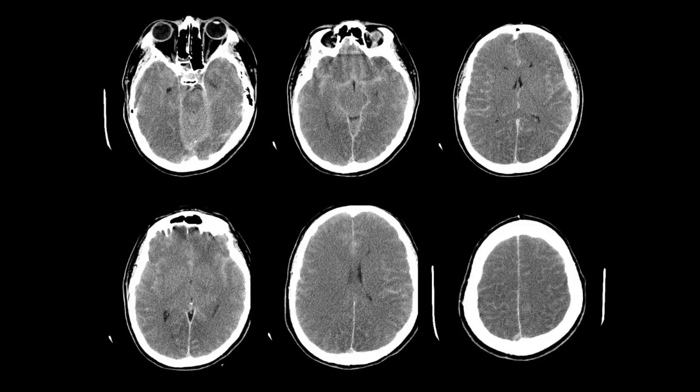We're going to finish our presentation. I wanted to show you that not everything that is bright on CT is necessarily an intracranial hemorrhage, and that's something that is very important to remember. There are a couple of mimicking conditions. So you have this patient, and if you look at this patient and at this CT scan too quickly, you might falsely conclude that you are dealing with diffuse subarachnoid hemorrhage.